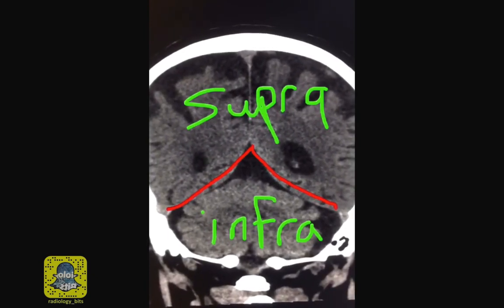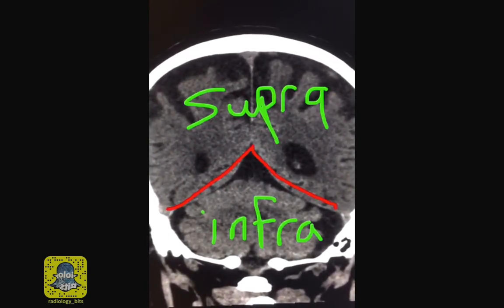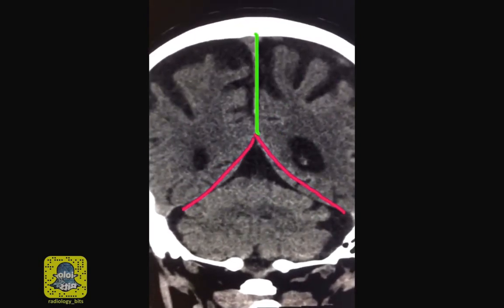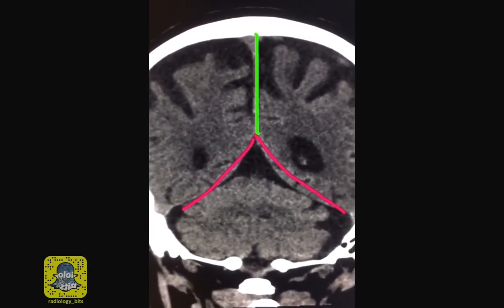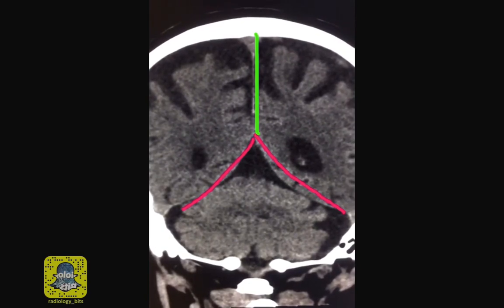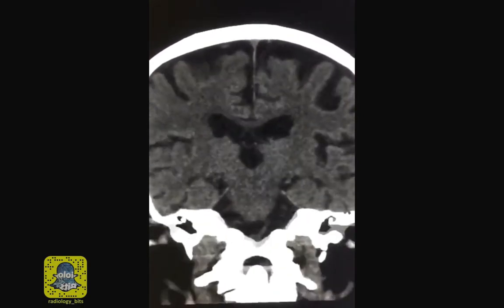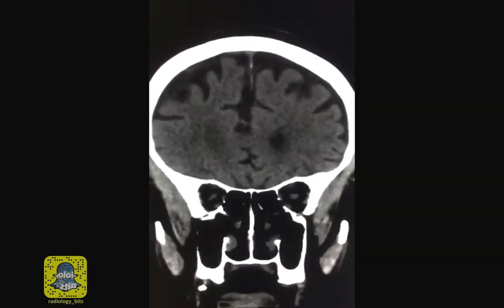And this is your tentorium in red, separating the supratentorial brain from the infratentorial brain. It's also easy to see the falx on the coronal image. You see it here in green. I'll scroll back and forth just to give you an idea about the falx and tentorium.